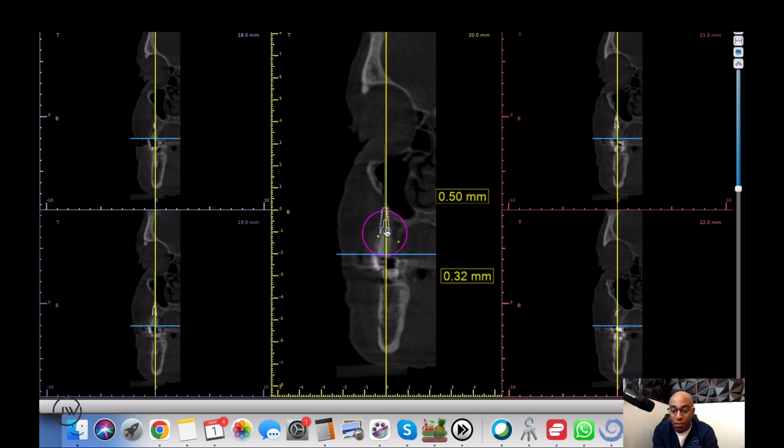All right, now we have the implant. We see that it's sitting out in the sinus and outside the buccal plate. So we just want to orient this in the right area that we want. And you could see here that this tooth is pretty large, and it actually mirrors the same width of the actual implant that we're working with. So the good thing is that we don't have to do any extra careful surgery.